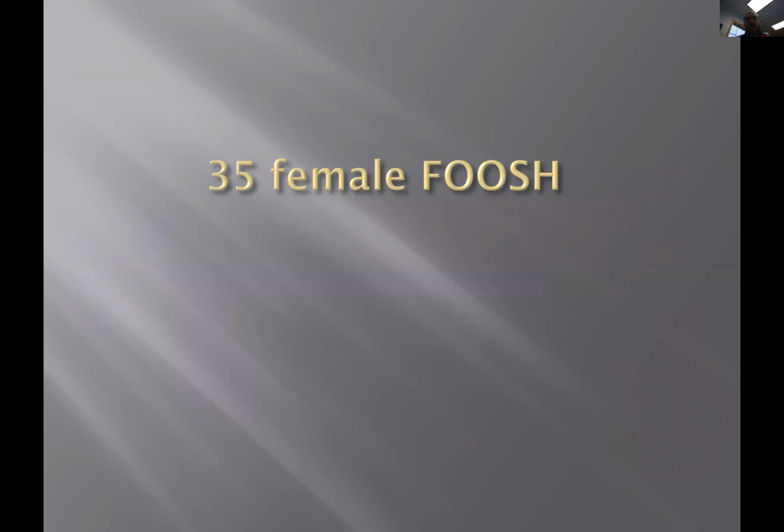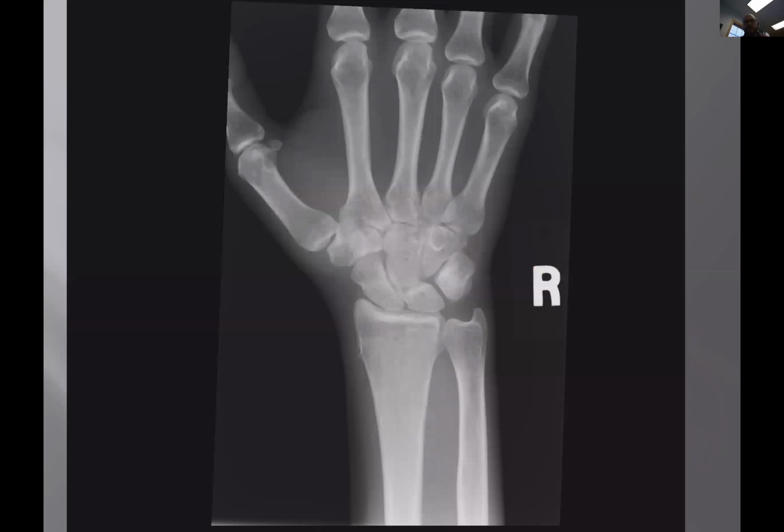Here's a 35-year-old female who fell on an outstretched hand. Okay, this is very recent. This is last week. All right, so fell on an outstretched hand and has significant pain in the scaphoid and in the distal radius. All right, anybody see anything in the scaphoid or distal radius? Scaphoid fracture right through the mid portion there, possibly. And then maybe even a distal radial fracture there with that buckling right in there.